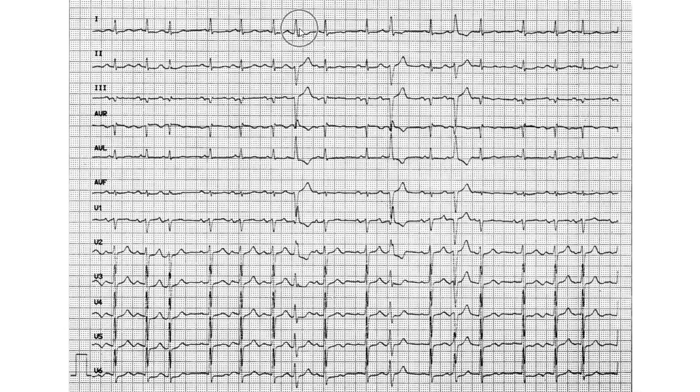So this is an extrasystole still, even if we don't recognize it as being an extrasystole on lead 1, it really is an extrasystole, and it really shows on the other leads because it has a totally different morphology compared to the other beats over here. Normal, normal, normal, bam, it's just like that. Okay, this as well and this as well. So we've got multiple extrasystoles, so we just call it flat out irregular rhythm.